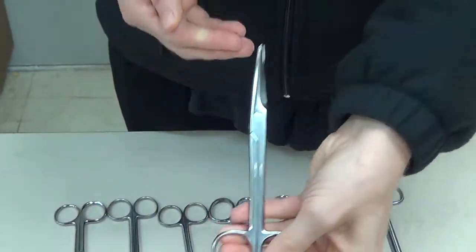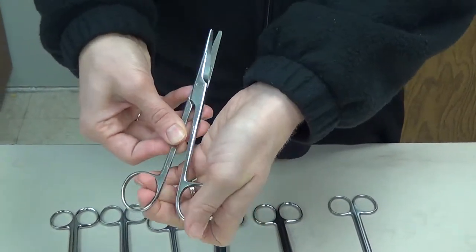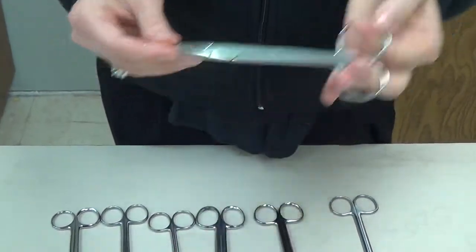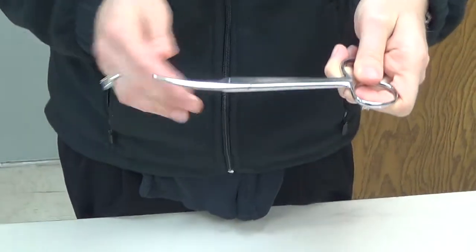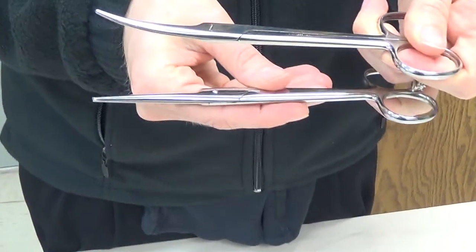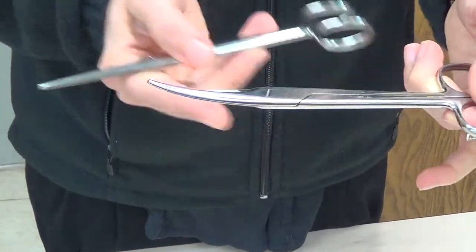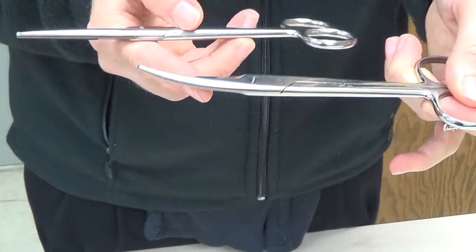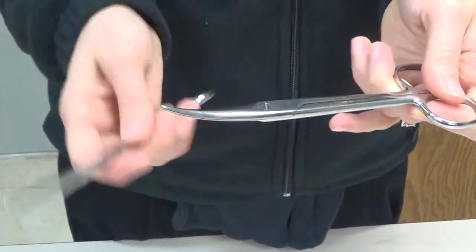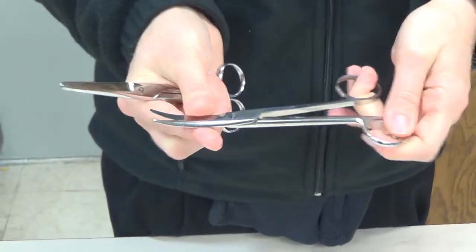So this also will come in various different lengths, just like the Metzenbaum, and is very commonly utilized during a case. Now, in general, also when it comes to scissors, anything that has a curved blade on it, we're going to use for dissection of tissue. Anything that has straight blades, we're going to use to cut suture, dressings, drapes, anything like that. You never want to use a curved scissor to cut anything else except for tissue, because you'll dull the blades, and sometimes you can cause little nicks in them that when we would dissect through the tissue, then it would give us rough edges, which are not going to heal very well.